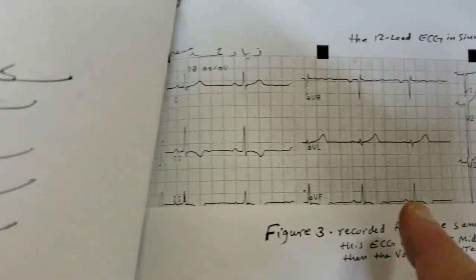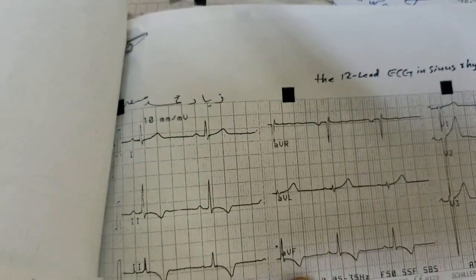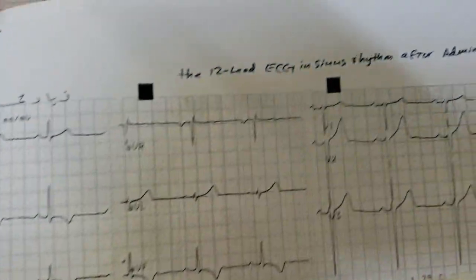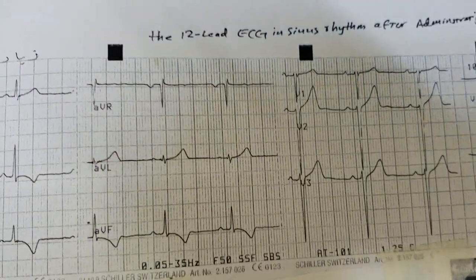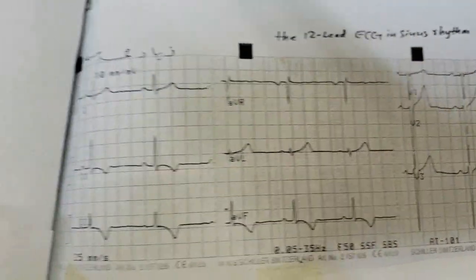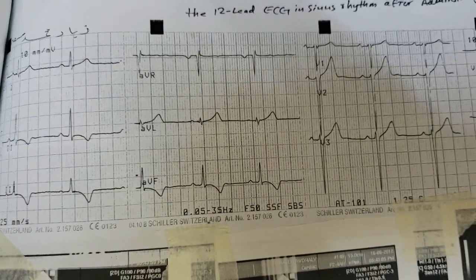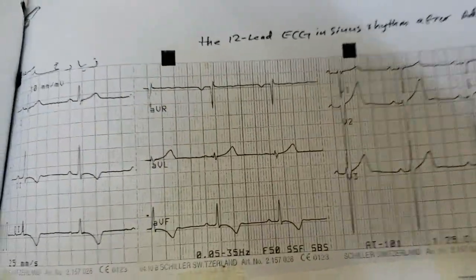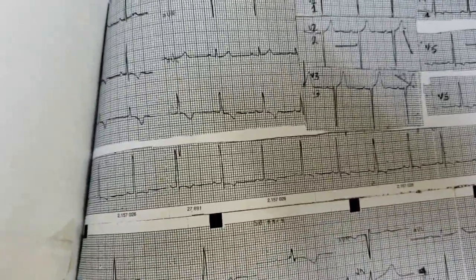This is the sinus rhythm, with a relatively normal ECG apart from inverted T waves in the inferior leads, because he has inferior wall non-compaction, and he also has an interventricular moderator band. But we don't know the relationship of these structural changes with the Belhassen criteria. And this is another ECG at sinus rhythm.